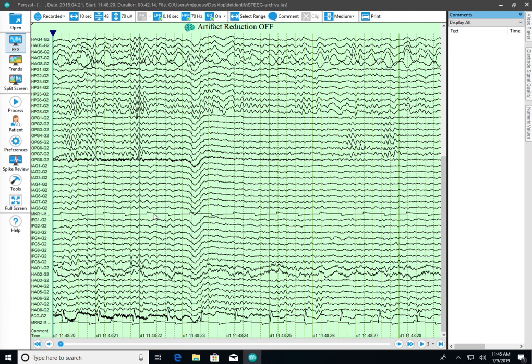You don't have to do this, but it allows us to do some other things. For instance, use it for review and to avoid having to make extensive modifications. For instance, if there were a lot of channels that were unused, turning them off in the detector. So either way, but I'm just going to go ahead and do it this way.